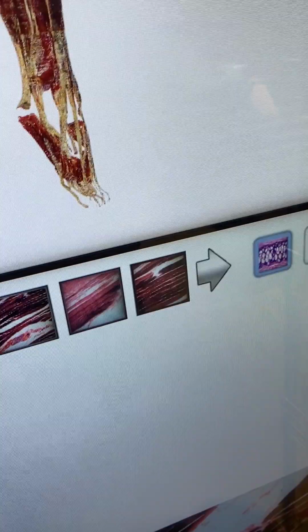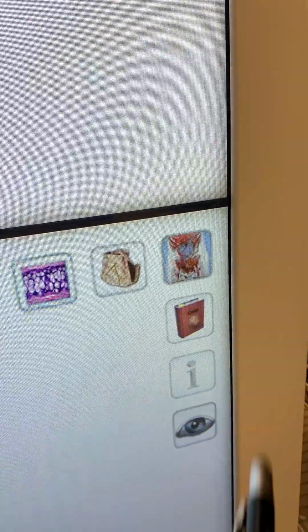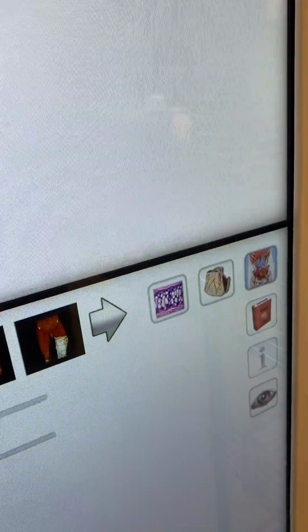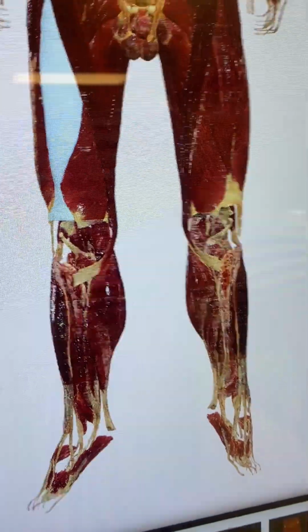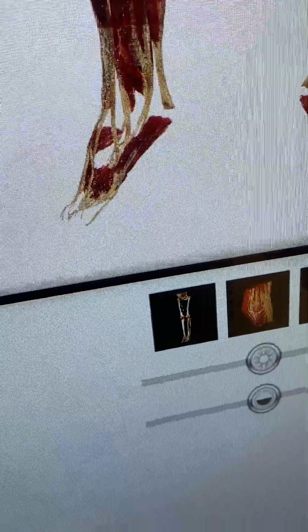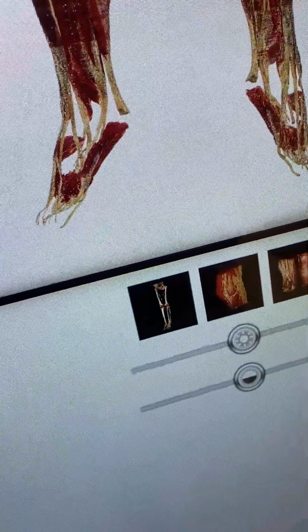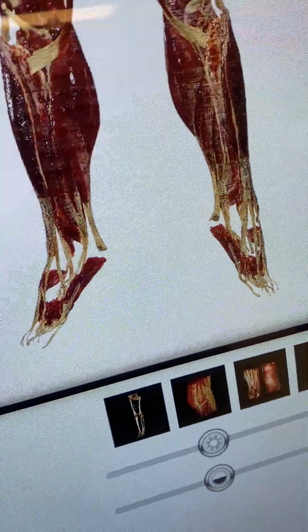The next icon is the DICOM icon. So what is this icon, DICOM? These are pre-annotated CT scans related to the area you choose. There are different images already in the computer, and you can choose the specific scan and see this scan compared to the segmented anatomy that is on here and that you want to study.